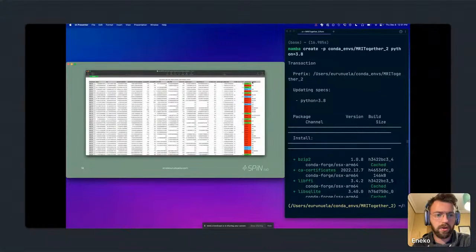So I have already colored the accepted ones green, rejected ones red, and then there are some ignored components that are blue that TEDANA will, by default, consider as good just because it didn't know how to classify. So it will be more conservative, let's say. And it also says the rationale behind rejecting and ignoring components.